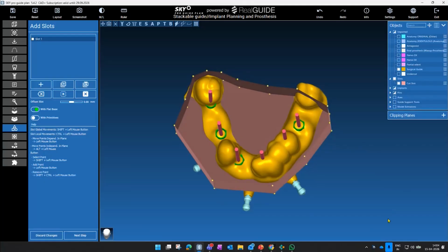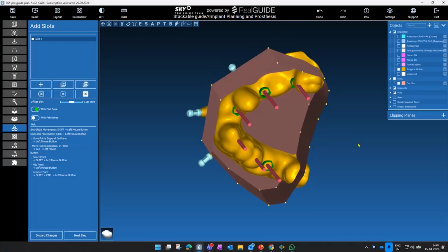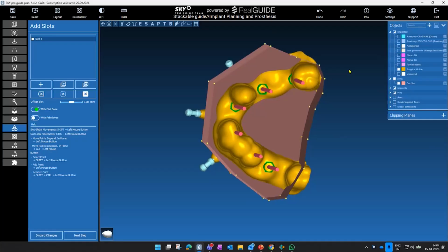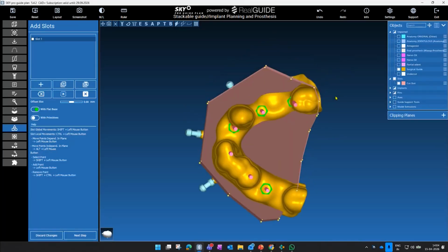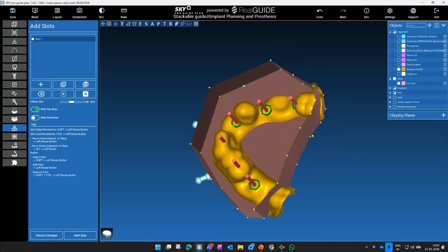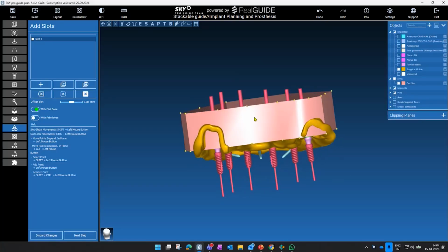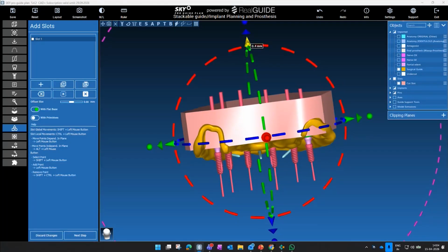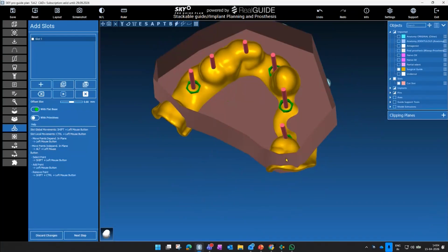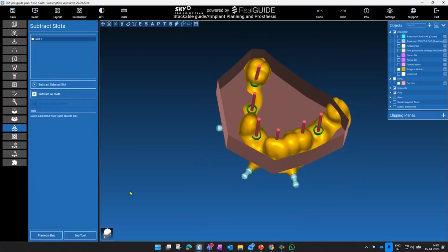So if you think this is fine, this step will take some time for you to understand when and where I am cutting. We will make some mistakes and then rectify them, again repeat some mistakes, but in time you will understand it. Even now I tend to make some mistakes, but then I know how to rectify them. For example, see this part is getting cut. I don't want that to happen. So I move it a little up. Then if you're happy, go to next.